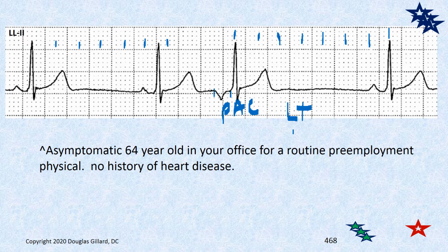And yeah, the other thing some of you might be looking at is the spike in these T waves. Okay, I think I have some slides on those coming. You have to be careful with those because we talked about an elevated ST segment as a sign of myocardial infarction or acute pericarditis, but there is an EKG finding that precedes that, and that's called a peaked T wave. The trouble with this is, if it was a myocardial infarction, typically they're up higher than this. They're more than 50% of the height. So I wouldn't suspect this to be a pre-heart attack happening.